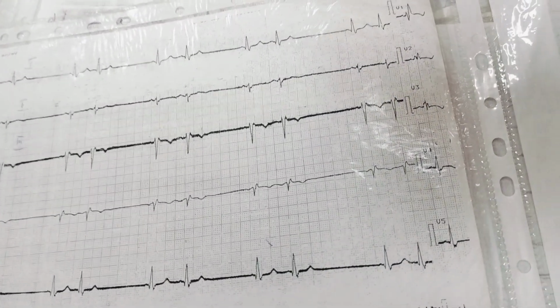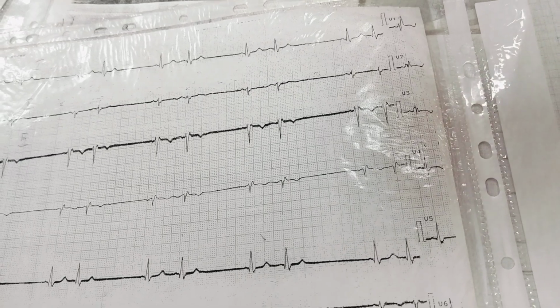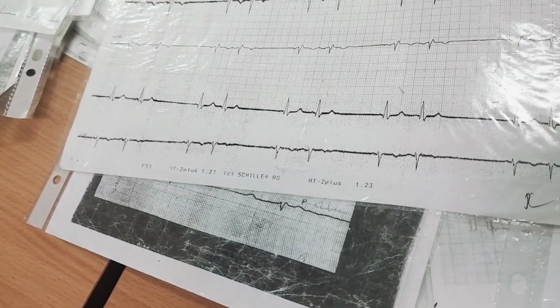That's it. Another person with myocardial infarction. Is it hard? It is. Yes, of course.